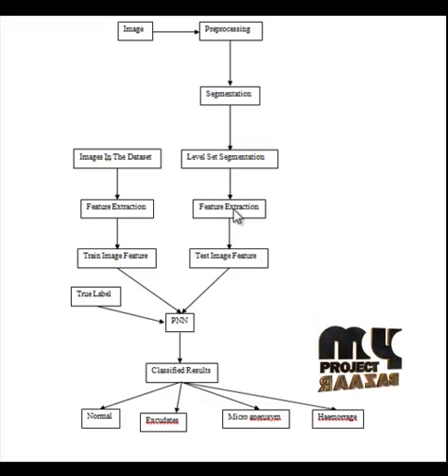For feature extraction, we are using the local binary pattern algorithm. The LBP feature vector is the simplest one, created in the following manner. The image is divided into cells. For each pixel in the cell, compare the pixel to its neighbors, following the pixels along a circle, clockwise or counterclockwise. When the center pixel value is greater than the neighboring value, write 1, otherwise 0. This gives an 8-digit binary number.